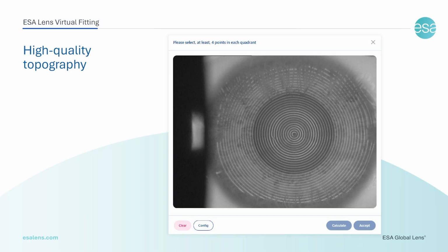If the corneal photograph and the ellipse construction module are available, the ellipse construction window will automatically open. You must ensure that all technical requirements are met. Specifically, the image should clearly show the limbus and the adjacent sclera across all 4 sectors: superior temporal, superior nasal, inferior temporal.